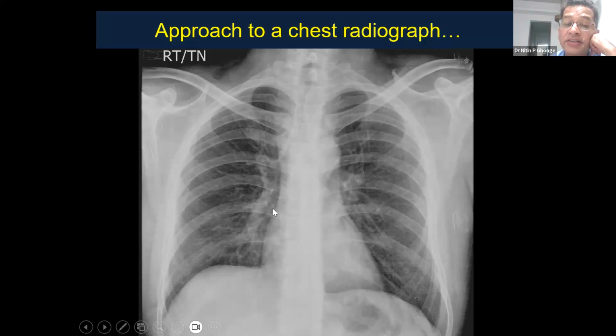So pulmonary edema is something important which should be looked for from nephrology point of view. And then again, for any opacity, pleural effusion as a sign, or pericardial effusion where you will see cardiomegaly, and then looking for abnormal opacities like pneumonitis or cavitation in the lung fields.